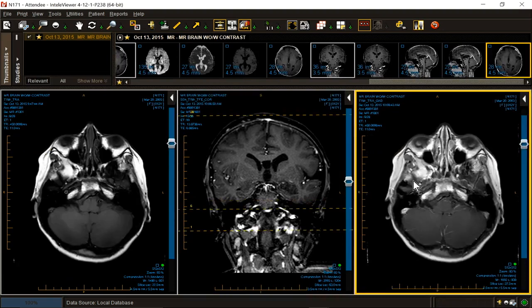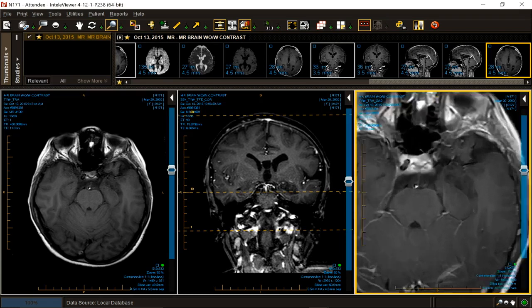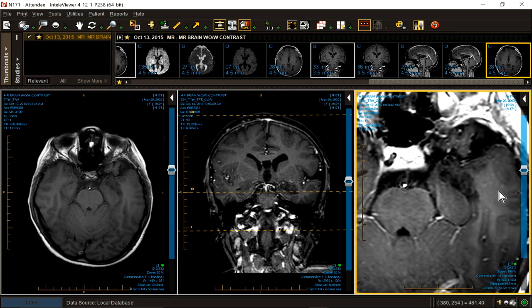Do patients with NF1 have a higher incidence of DNET? They do. One of the characteristics of DNET is it has this arrow-like oval configuration. I'll blow it up for you. This is an important tip-off. Slightly bubbly, pointing towards the cistern, arrow-like with a tail, not an enhancing tail, paucity of edema, paucity of mass effect, consistent with DNET. Pleomorphic xanthoastrocytoma, tend to see some high signal inside. Tend to see a little more enhancement. Let's talk briefly about DNET.